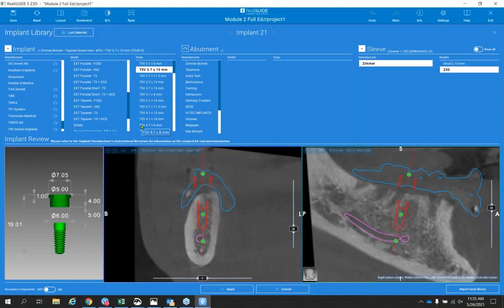So that opens up our implant library. We click on the position we're going to place our implant. What happens is the software opens up its library. The first thing I want you to notice is that not every single implant is downloaded, and you don't want that. You really only want to download just those implant systems that you most frequently work with. And you can see here, everything's in the cloud. So if you see a system that doesn't have the cloud, like Astra, Vigo, BioHorizons, these are systems that I've already downloaded into the software.